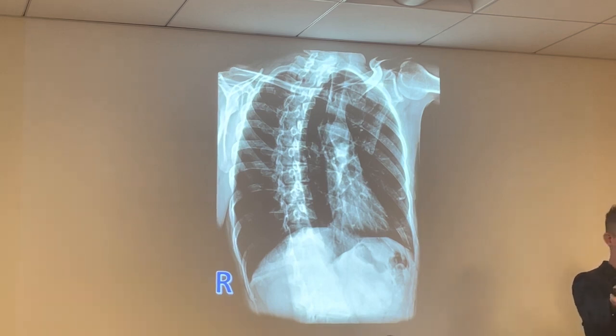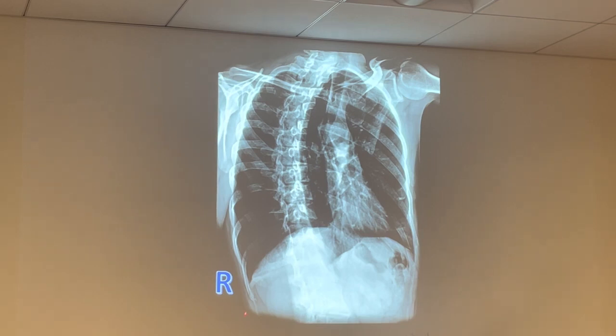So say it a little louder so we can hear it. All the PA projections, the opposite side is marked. All the AP projections, the same side is marked. And now you just have to figure out if it's left or right, which we know with the marker. Say it one more time, because I still have some people that are not hearing it. When you look at a PA projection, the opposite side that's elongated is marked. The AP projections, the same side that's elongated is marked.